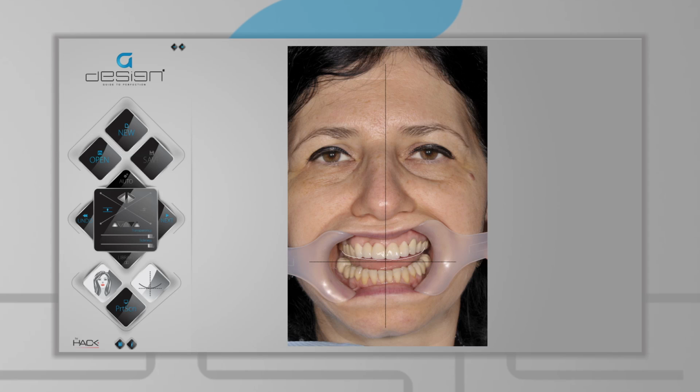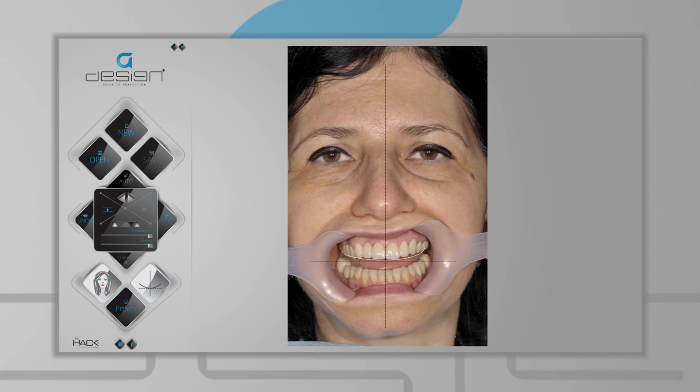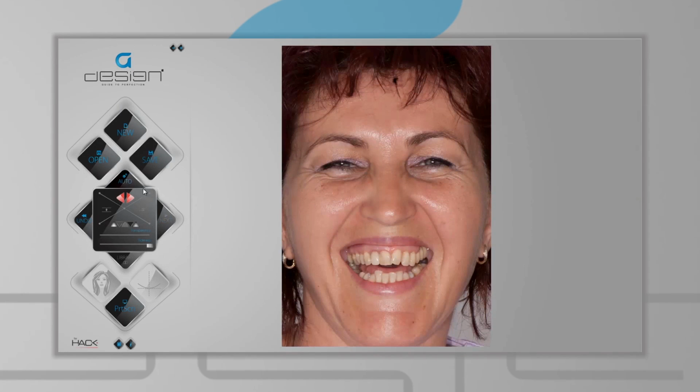The checkup is another very important use of this application. Transferring the axes to the plaster cast.